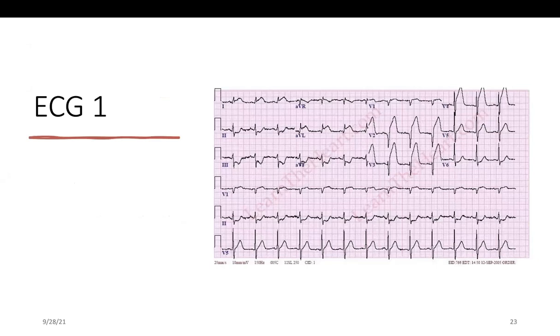So let's go to the ECG. Please, I need you one by one to read the ECG, please. Yalla, we start with you, Doctora.